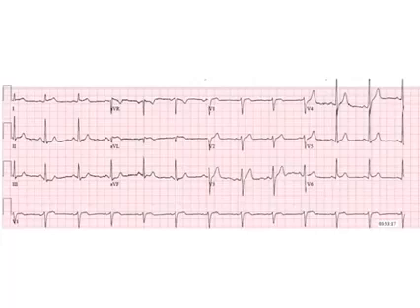The reason that I bring that up is because a lot of medical students look at V1, V2, V3, V4, and they're like, wait, is this a STEMI? Is this an ST segment elevated myocardial infarction? But it should go up from V1 to V4. So this is normal. Stare at it, get comfy with it.